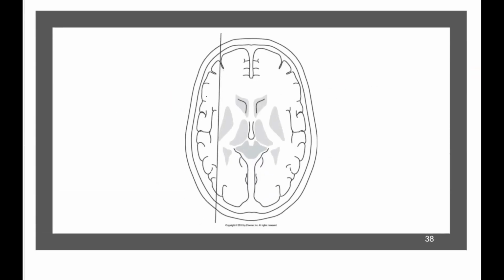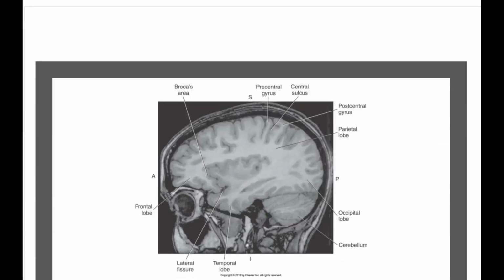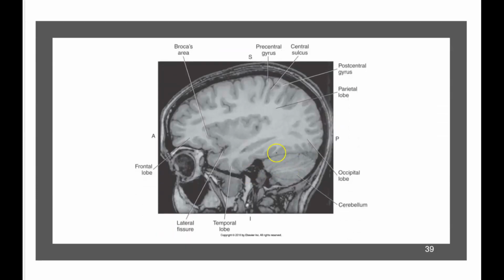So here we're going to be looking, it looks like, at the temporal lobe, we're heading far right and from midline right. So we're going to be looking at sagittal. And here we are. So we have our pre-central gyrus with our central sulcus and then our post-central gyrus, okay? So this is an area that the radiologists look at a lot. It does affect strokes, so it's important that we do look at that area.